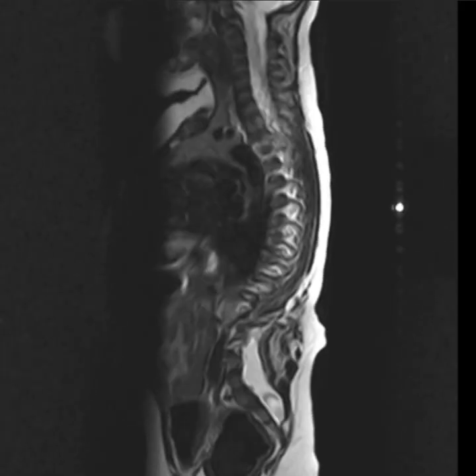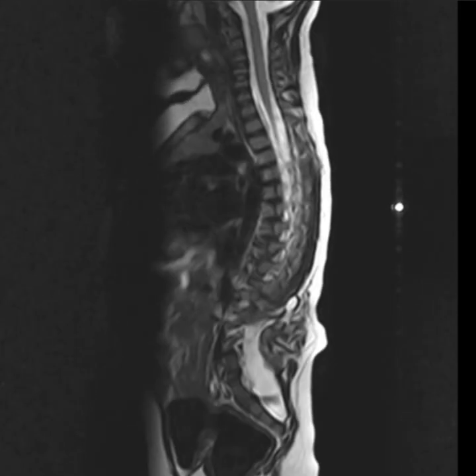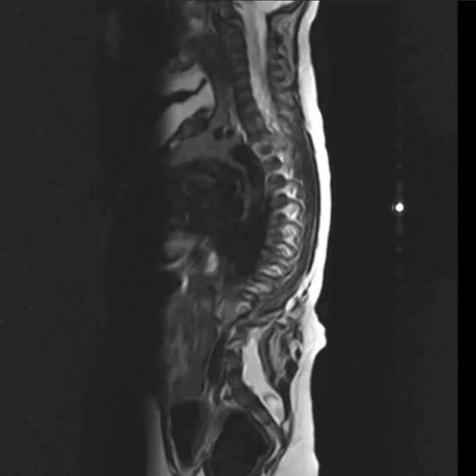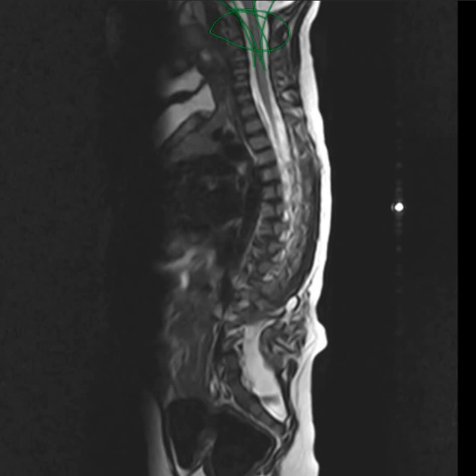In cases of congenital abnormalities of the spinal cord, always look and think about the base of the skull, the level of the foramen magnum here. You need to see if there is any sign of herniation of the cerebellum or any abnormality at the craniocervical junction, because sometimes there is an important pathology here, like some sort of Chiari malformation. This is the first thing.